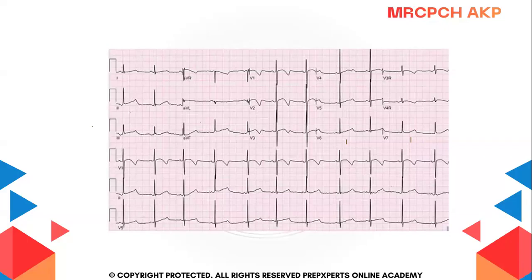So here we can see the long QT. Who can tell me? Can you guys appreciate it?